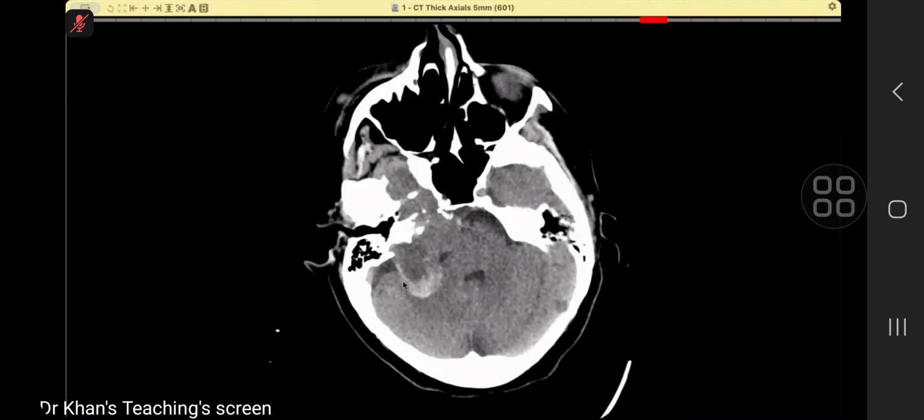It shows internal regions of high density. So I am suspecting some neurofibroma or schwannomas. So I will further confirm my findings on the post-contrast imaging. And also I would like to see this on the bone window.